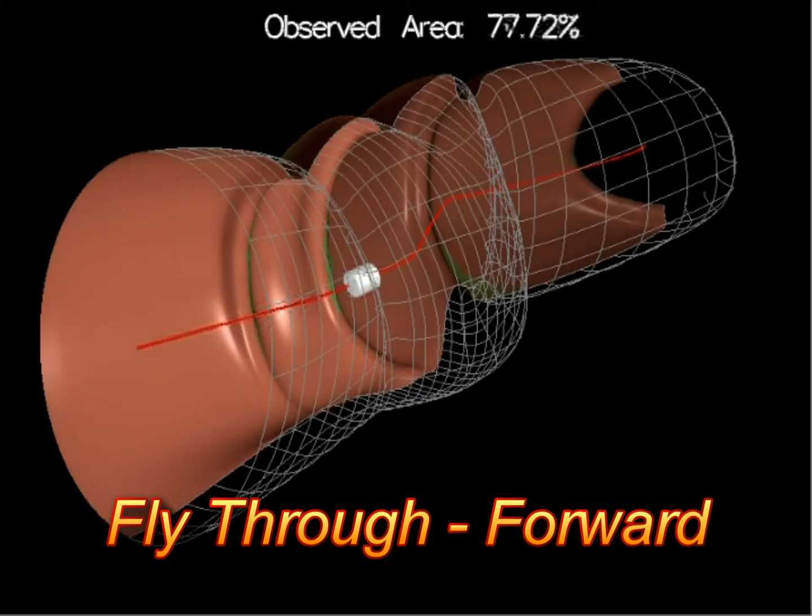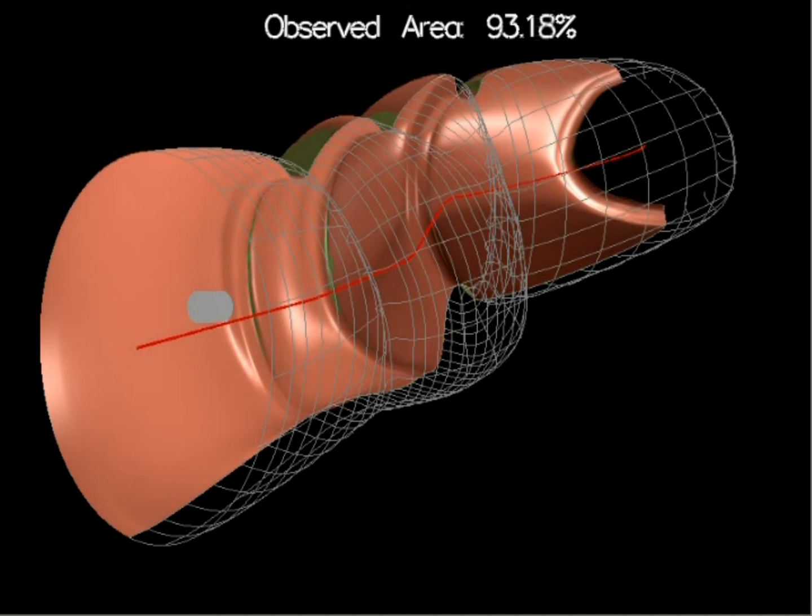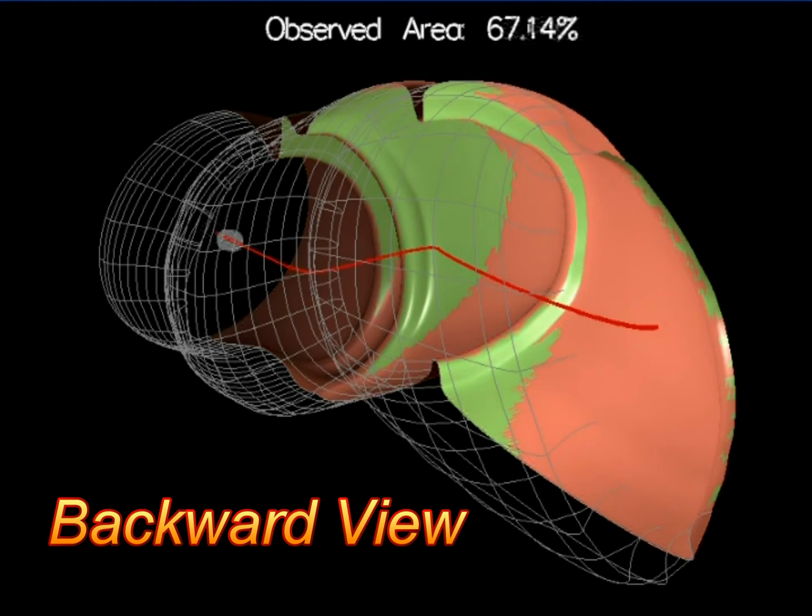As you can see from the mucosal inspection percentage shown at the top, during fly-through without any tip deflection of a relatively straight colon segment with shallow haustra, about 93% of the mucosa is inspected. This estimate from EndoMetric fly-through measurements agrees well with estimated percentages from expert endoscopists. Of course, we can fly through the colon in forward as well as backward direction.